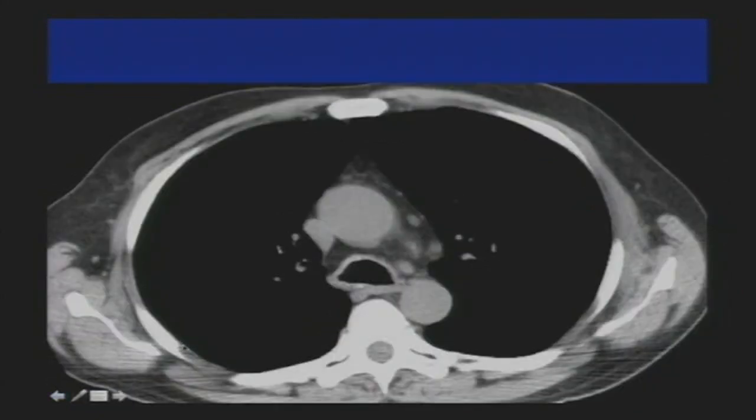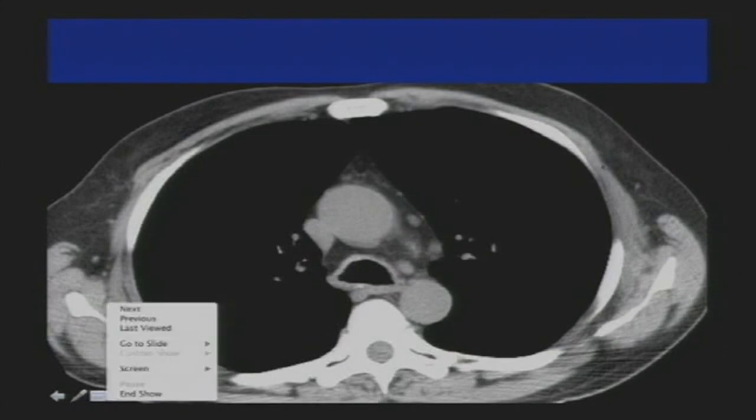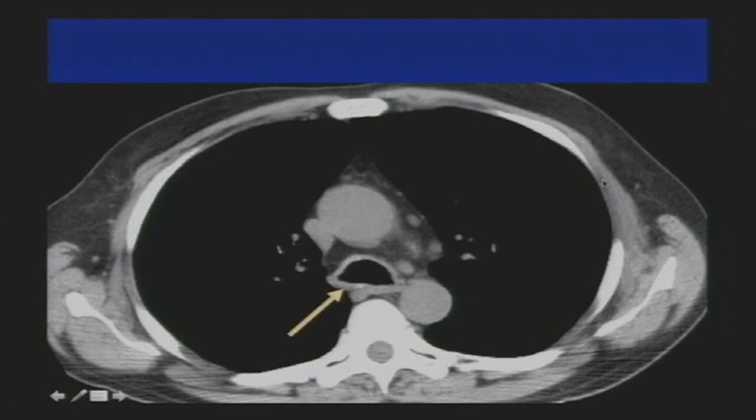Okay, to compare that to this case, which also was an example of diffuse tracheal wall thickening involving the central bronchi, but see how the posterior membrane in this case is involved. So that's not going to be relapsing polychondritis. That's going to be likely sarcoid, amyloid, or Wegener's. And then if you want to throw in some of those extra rare diseases like inflammatory bowel disease and infections, you could. But mainly those three you want to throw in, and that's a patient with amyloidosis of the airways.